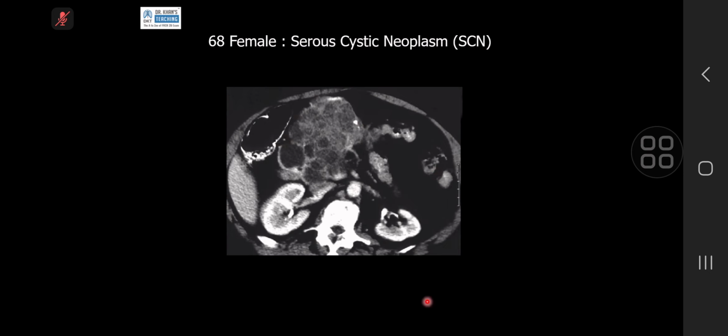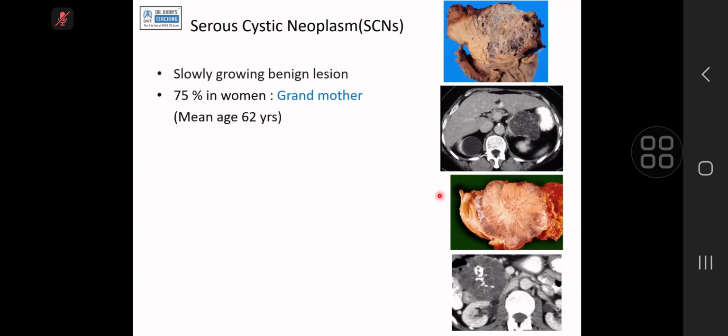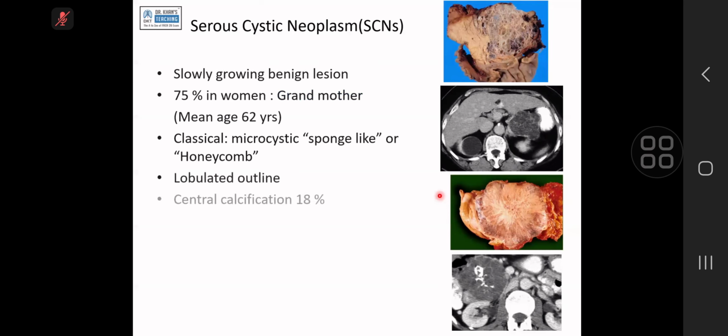The cyst will usually be smaller, and there can be larger cysts also. And if you do an MR, all of these will be very tiny, tiny cysts. Now, can it be head or can it be tail? This is a usual thing where, in my experience, so many registrars just think that it can only be in the head because somebody has documented in textbooks that the head is most common. That doesn't mean that it cannot happen in the tail. Please remember, and for me, that is a very bad discriminator.